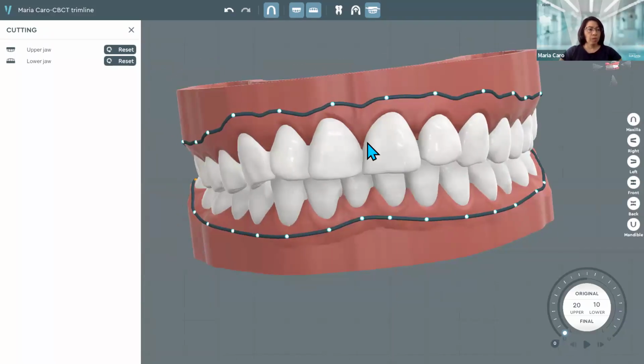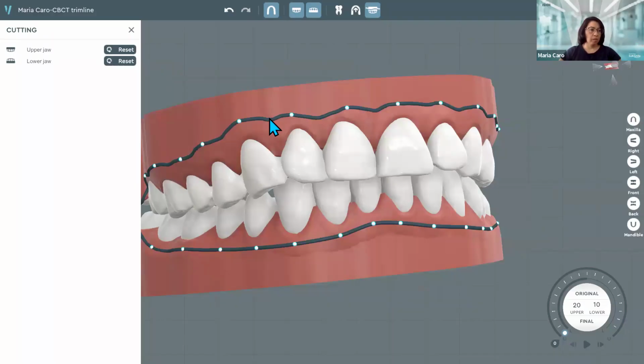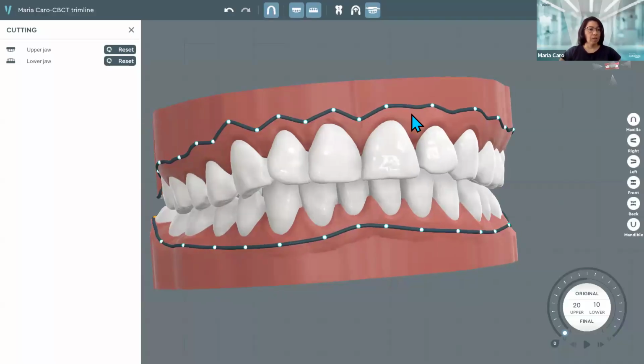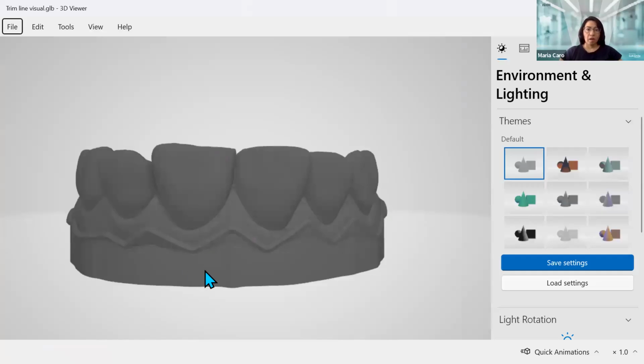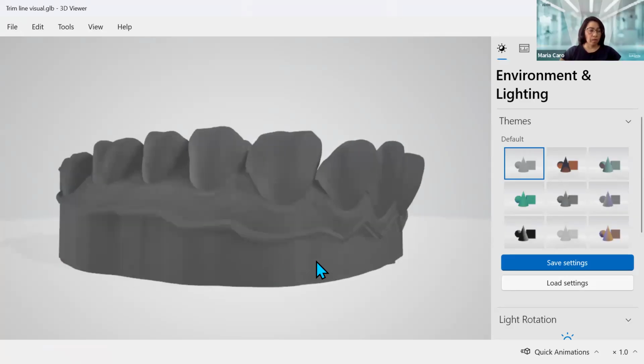Okay, so in order to design your lines a little bit better for the scalloped look or straight line look, you would go ahead and still generate your look based on the preference for your doctor or your lab. And then you can go ahead and generate the scalloped ideal cutout line. And so how this is represented is once you export the case, this is what will happen. So when we say convex line, this is the convex line that will be represented on the model.